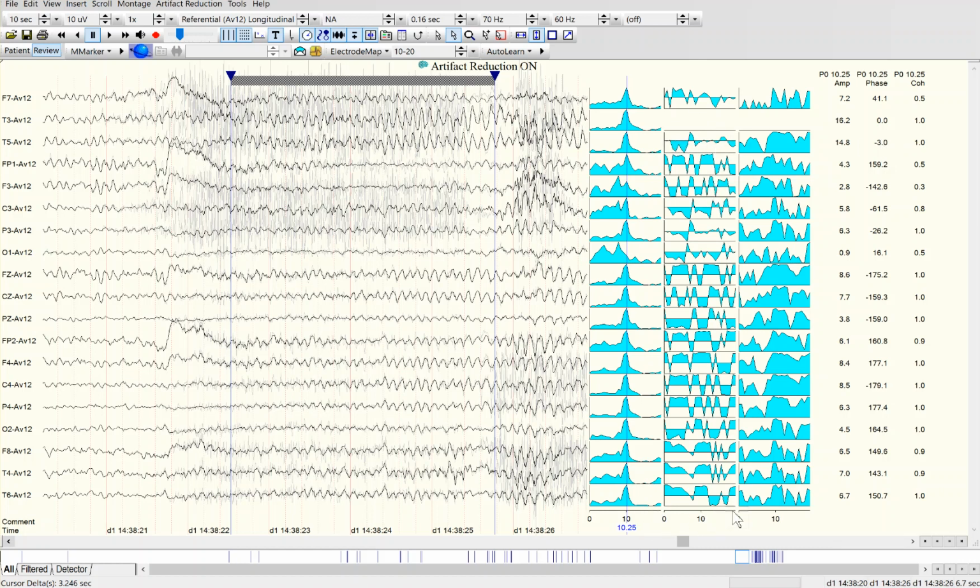We're looking 0 to 20 hertz. And so this is the phase relationship across those frequencies. And this is the correlation, or the coherence by frequency, right? So here we can see that it's maximal, pretty much from 10 up to 15 hertz here. So there's the output, and you can look at that across channels. You can change the channel that it's doing the comparison with.